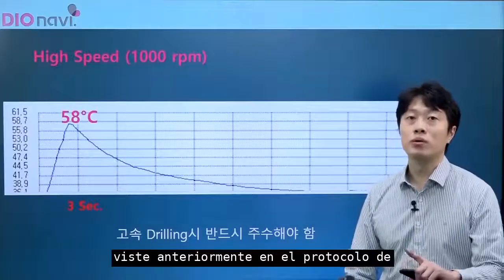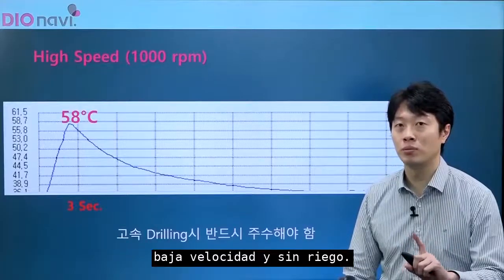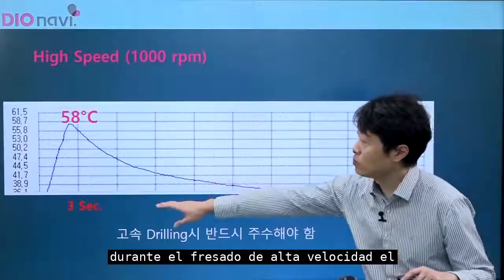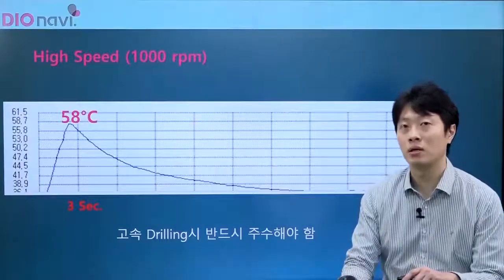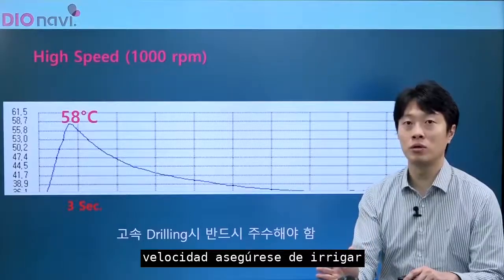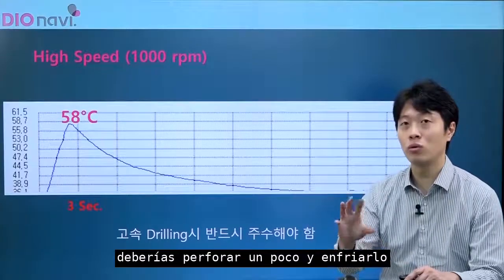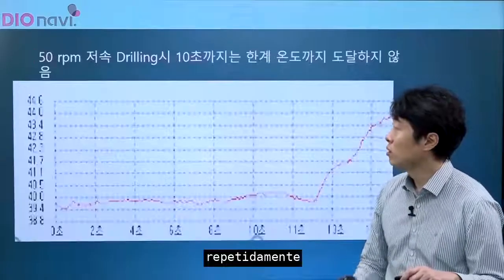You saw earlier in the drilling protocol that drilling was done at a low speed and without irrigation. A study result showed that during high-speed drilling, heat rose to 58 degrees even with irrigation. So during high-speed drilling, make sure to irrigate. Also make sure not to drill too long at once. You should drill a little and cool it down, drill a little and then cool it down repeatedly.